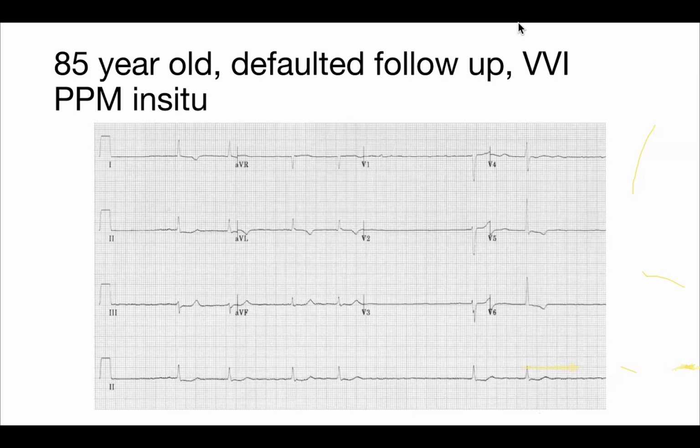That is the whole reason why, because pacemakers are programmed in such a way that they should be paced at least at 60 or 50. Usually we won't keep it below that if it's not an ICD, right? So here, if you see the fourth beat and the fifth beat, the gap is so far away. If the pacemaker is working, it will give a pacing spike at that time, but it's not giving one, right? That means there's a pacemaker malfunction.